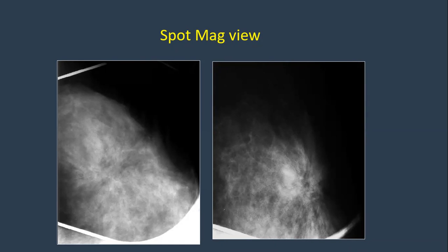It's important. How are we going to manage this case? So here you start. You will give BI-RADS. For me, BI-RADS 3. Why? To see, this is a baseline to see if there is any change.